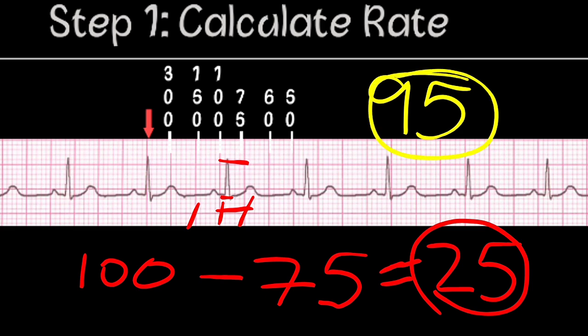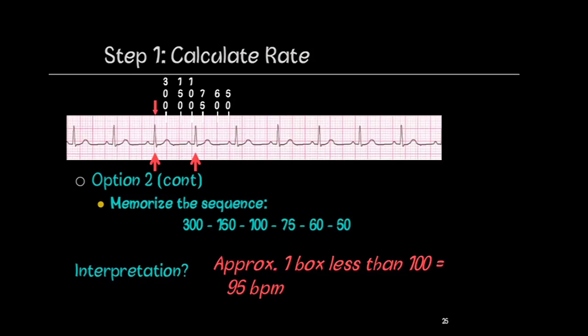I hope you got this. This method is very easy and it is very helpful once you understand this. And if you have any problem understanding it, you can just go back and watch this clip again. And here you go, we have got a heart rate of 95.